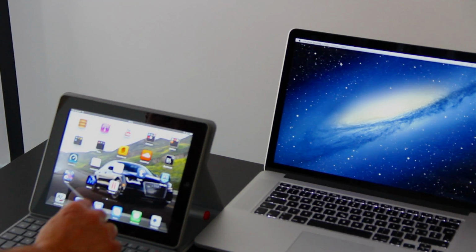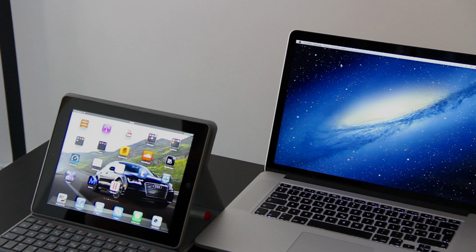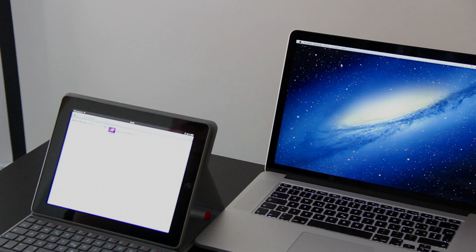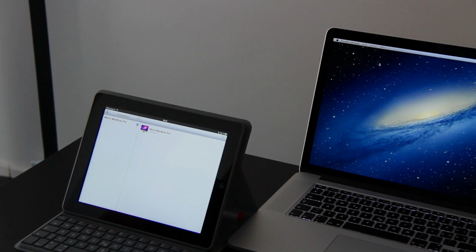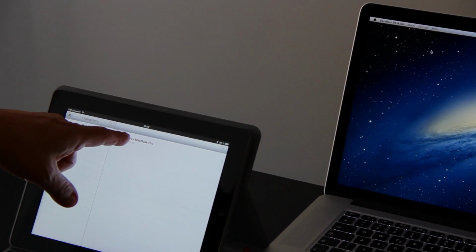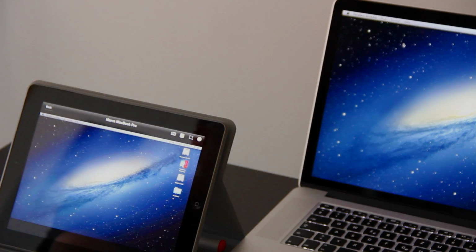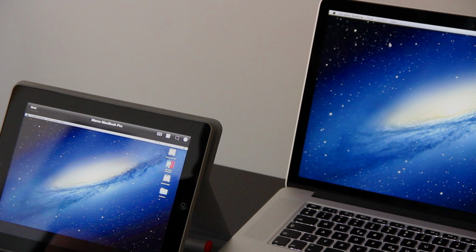What we need to then do is we go to the iPad, which can be in a totally different location, running across the same network. That's very important. So we click on Parallels. As soon as we do, we can log in and everything. I've already done that. So what we need to do is connect to the MacBook Pro that's listed on our virtual machines. So we just connect there, and we can see the desktop running on the Mac, running on a MacBook Pro, anywhere else on the same network in another lab or in another room.